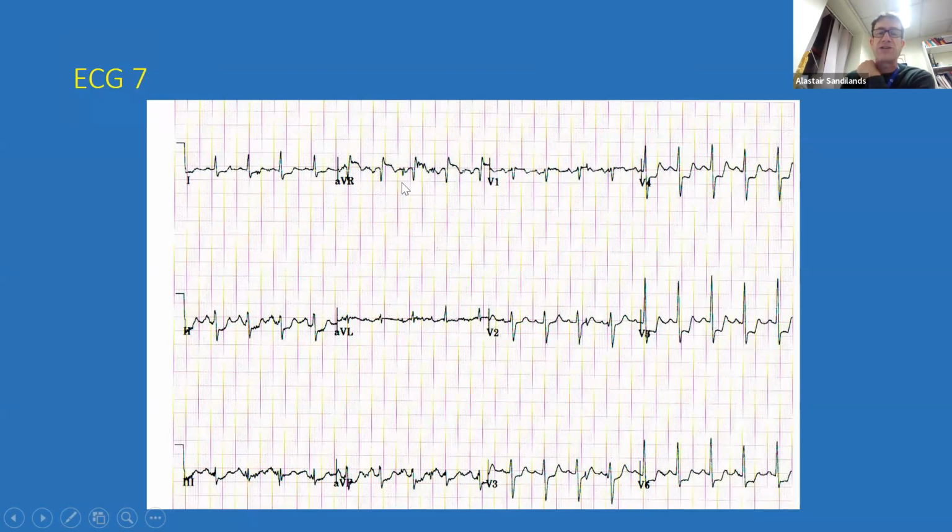And I think I might have to redo that question because I thought about it. I don't know whether the troponin was ever measured on this patient, with a treadmill, but they did have a left main stem problem. So there probably is ST depression. This is the only time you will get ST elevation with ST depression in all the other leads. AVR could be ST elevation. So that would be your reciprocal change in relation to the ST depression. That's the only time it happens, just to clarify that.